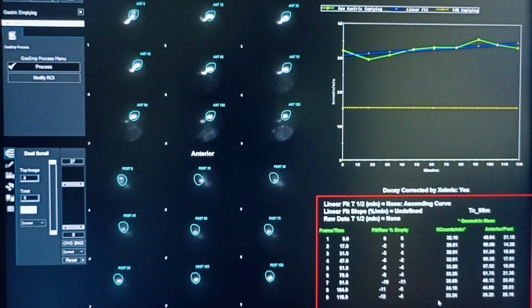Both are the same thing, no? Whether emptying or retention, but some doctors are keen to know the retention percentage. Whatever is remaining, the inverse of that will be the retention. Correct. So if 30% is emptying, then 70% is the retention. So both ways can be found out.